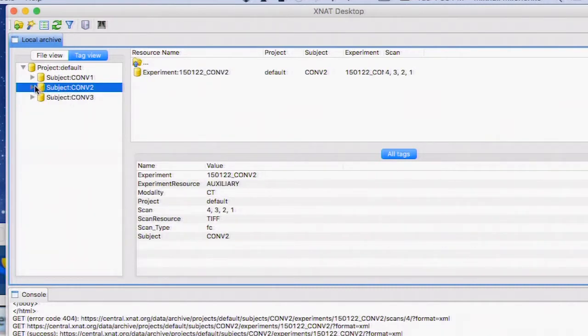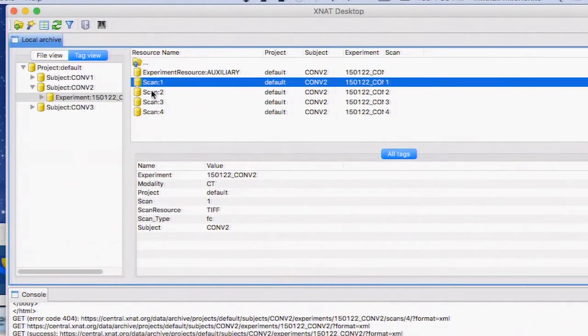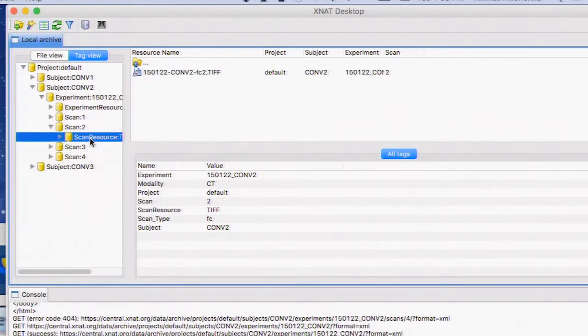And here, if some files weren't tagged, you just won't see them here. So you have to check. It would be a good feature to have a pool of incoming and outgoing files. There's a check before you upload for all required tags being present. So right now. Thank you, Misha.